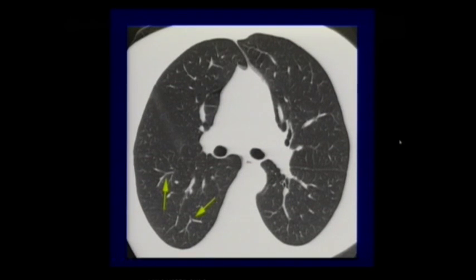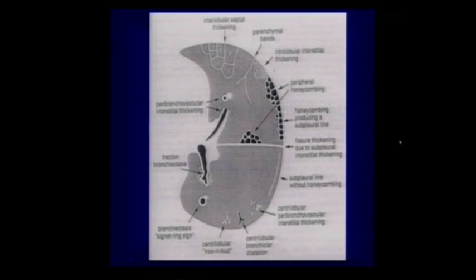Look at this one. The arrowed ones are arterial branches which just divide. But look at what you see in the upper part, the anterior part on the left side: you can see branches arising from a single structure. So that is a vein. That's how you differentiate between vein and artery in a radiograph. But the problem is that the findings on which you try to make the interpretations are numerous like this, and they are scattered everywhere in the lungs.